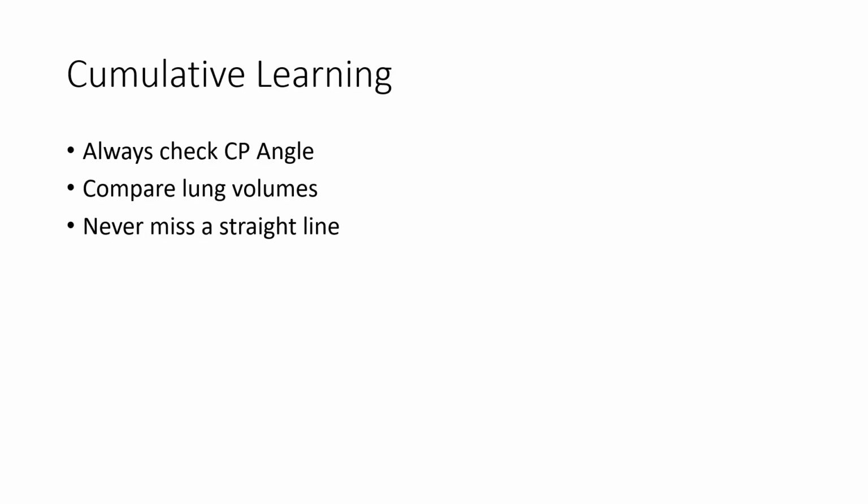So we'll have this cumulative learnings slide. The first session was about pleural effusion. I told you in every X-ray look for the costophrenic angle. In the second session, I told you to compare both the lung volumes in every X-ray. And in the third session, I'm telling you never miss a straight line in a chest X-ray.